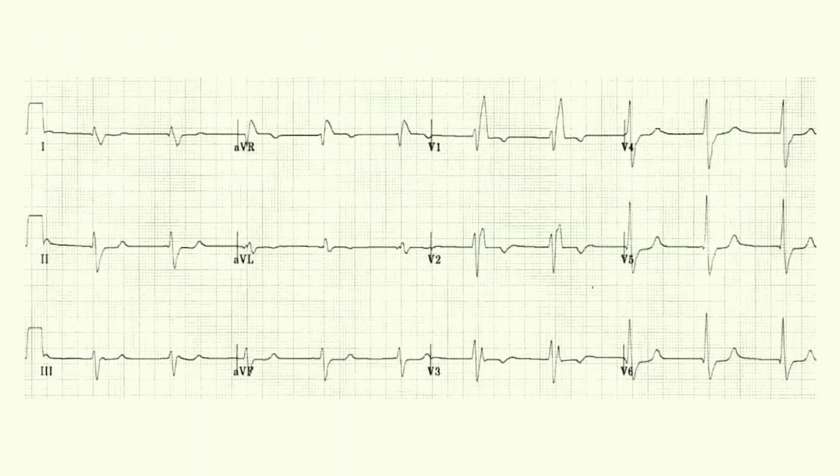Well, you take this ECG right here, look at lead 1. The terminal portion of the QRS, is that positive or negative? It's negative. So it's traveling to the left or to the right?